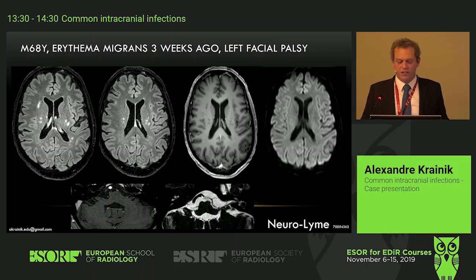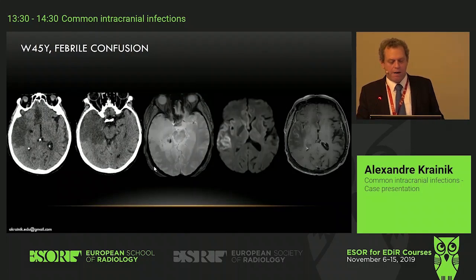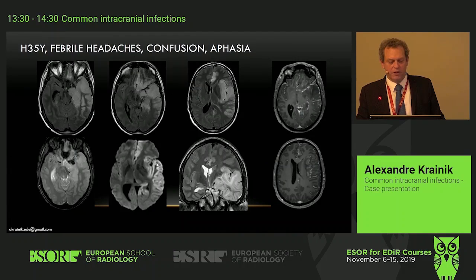The fact was that in this patient, there was only a very focal enhancement that was quite suggestive of Lyme, of the cranial nerves. Here on the cochleovestibular nerve. Okay, this is a case we've seen already. It was herpes. I will maybe have another case.